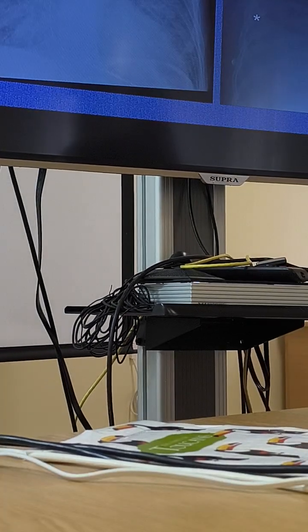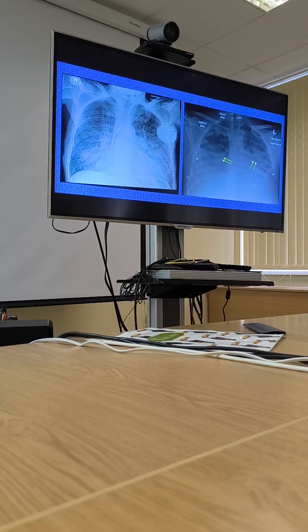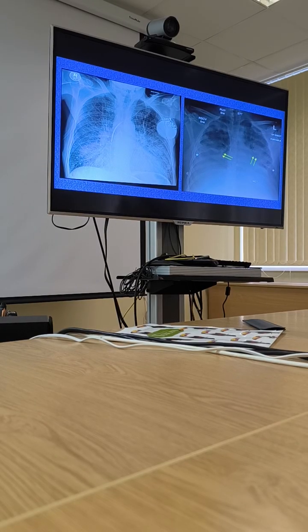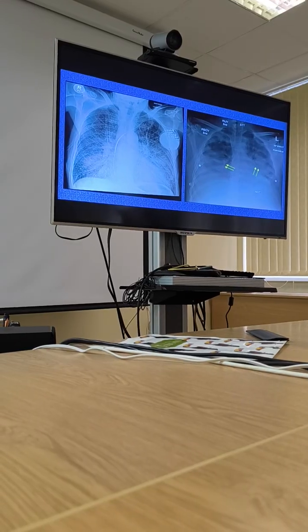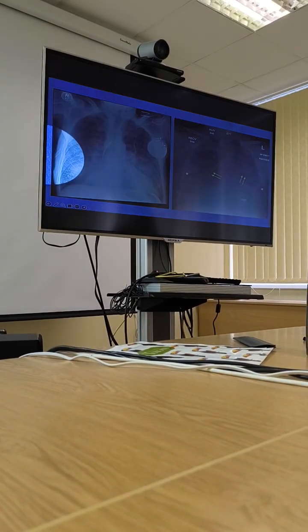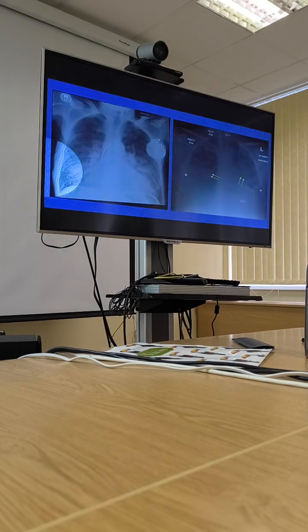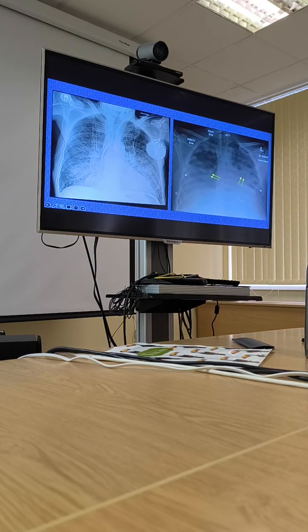And remember this picture from the section about vascular markings; this is a typical picture of cardiac failure. Big heart, bad hila, bad lung markings, this butterfly sign, and again this linear curly pattern. Probably what we don't see here is that these angles are still sharp, but it can be different.